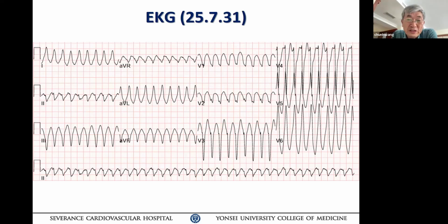So typically when you see this, you cannot exclude the possibility of what is known as a crux VT. So you will need to put it in the differential diagnosis. That might also explain why your transition is a little bit later than usual, and the unusual sharp notching. So those are things that we should probably discuss in the differential diagnosis.